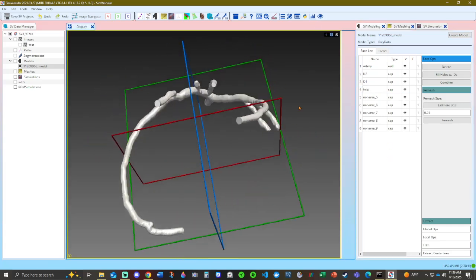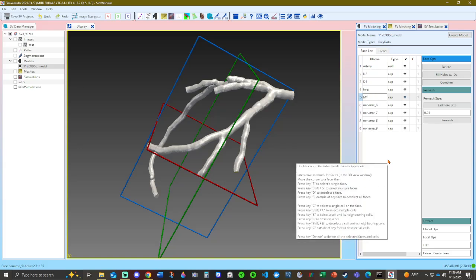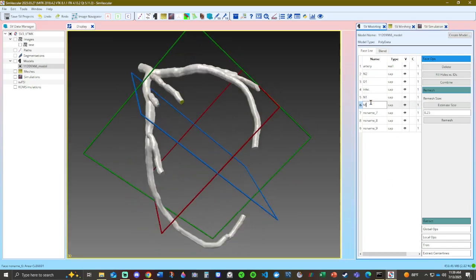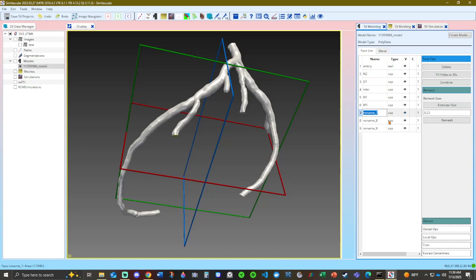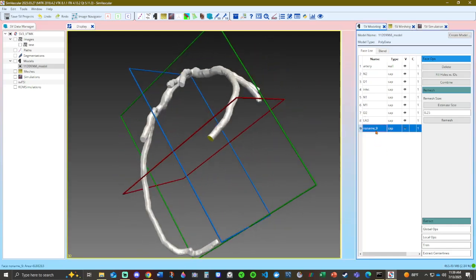I could have just ended the video, but I'm just going to make sure you get 100% of the detail here. This one is M1. No, N1. This one is M1. And this one is D2. And this one is your LAD. And the final one is your LCX.